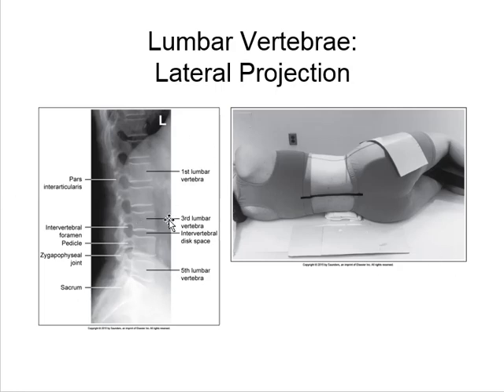So what we want to see on the lateral is an intervertebral foramina, that big hole right there. Nice big blocky appearance to the vertebra. The most common issue in the vertebra in the L-spine would be arthritis. We see arthritis quite a bit. With arthritis, we may lose some height in the vertebra or in the disc space specifically.